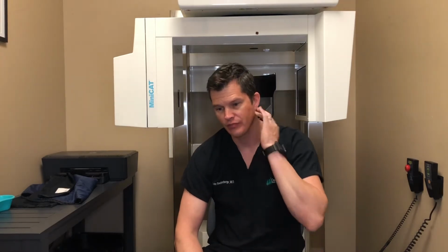So what is this thing? This is our CT scanner. We have a CT scanner in our office that allows us to take CT scans, usually of patients' sinuses, occasionally of patients' ear bones or temporal bones. It's extremely helpful. Basically, you cannot operate, or you should not operate on the sinuses without a CT scan first, because it defines the anatomy, where you're going to work, what sinuses need to be worked on. When we see patients that have a growth or something called a polyp in the nose, we need a CT scanner to see where it comes from.